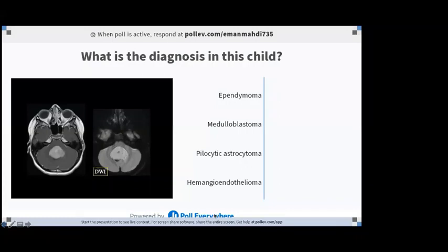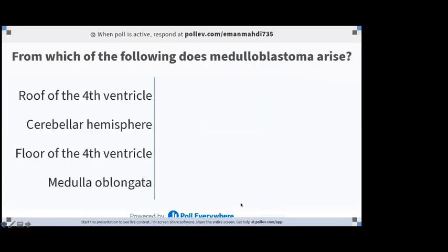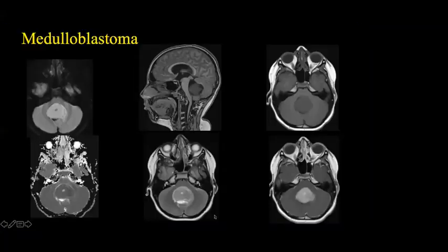Okay, so it's medulloblastoma. We get another question. Both. Okay, good job. So it's a case of medulloblastoma.